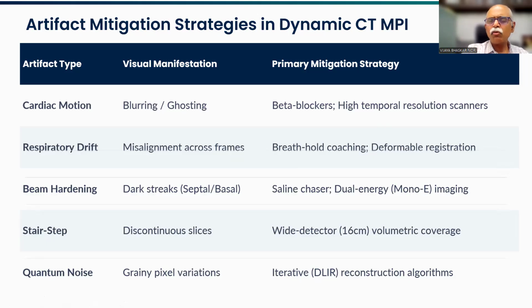Coach the patient even before you start the study. Coach the patient not to take a high breath hold, not to take deep breaths, and to do very shallow breathing for the 20 seconds. Automatically, you get a good study. All the images I have shown you are shallow breathing studies without any artifact, and all of those are done on an AI server.